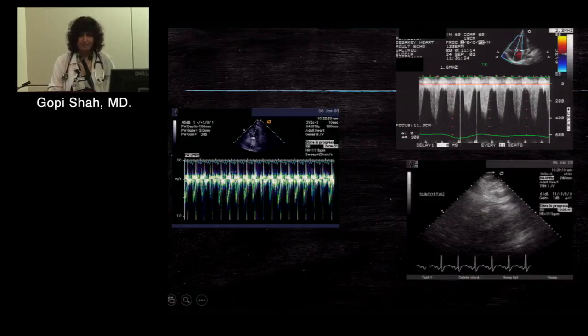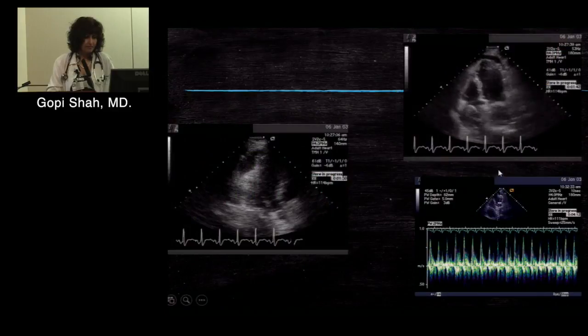And so you have, this is your mitral inflow here. We don't have a respirometer here, but you can see definitely there is significant variation noted, and it actually follows almost a breathing pattern here.